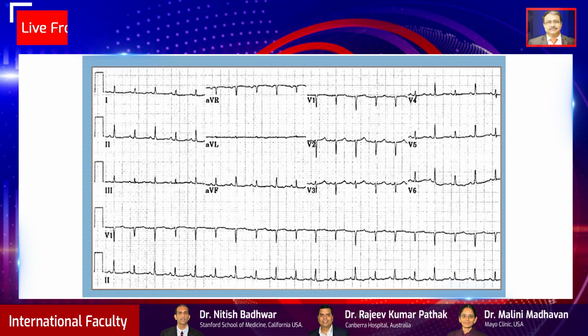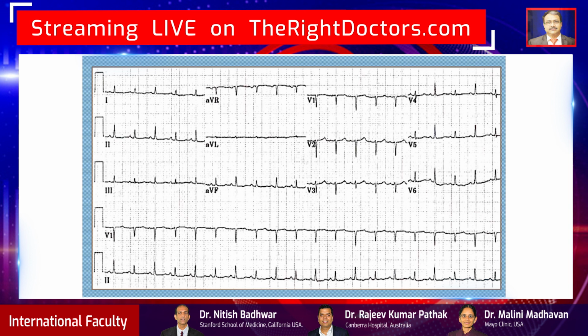So let us start looking at some ECGs. As Dr. Ullas was telling, all the ECGs are going to be abnormal from now on.